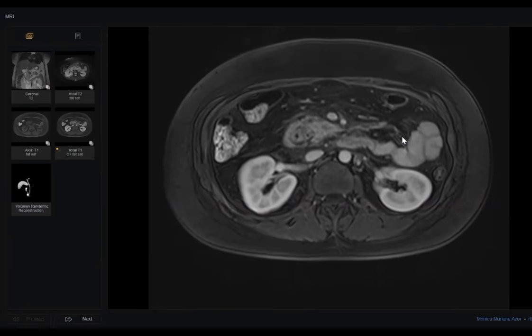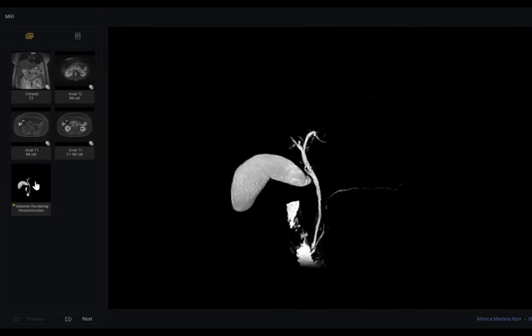Because the second part of the duodenum also appears swollen to me, it can be a possibility that focal... So do you have a view here? This is the MIP image from the MRCP, in which I can appreciate that.